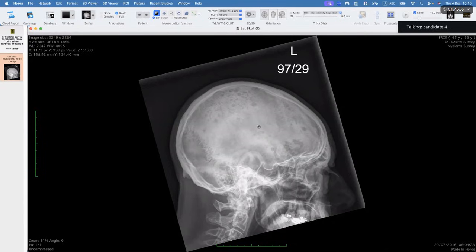So keeping in view the age of the patient, my differentials would be METs versus myeloma. Since the density of the cervical vertebrae on this radiograph is also somewhat osteopenic, I'll consider multiple myeloma as well and would like to screen the patient for myeloma as well as METs.